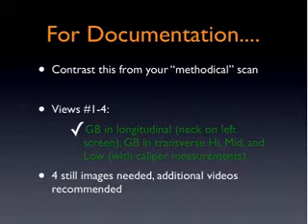Before we launch into a discussion of sonotechnique and image acquisition, a quick mention of documentation. We'll reiterate this towards the end of the lecture. For documentation purposes regarding the gallbladder, you'll need to save 4 different views. The first view is the gallbladder in longitudinal, and then the gallbladder in transverse high, mid, and low with calipers that measure the gallbladder wall thickness.